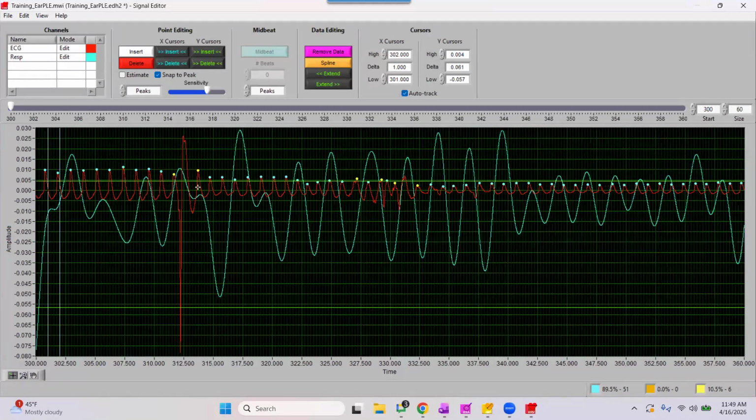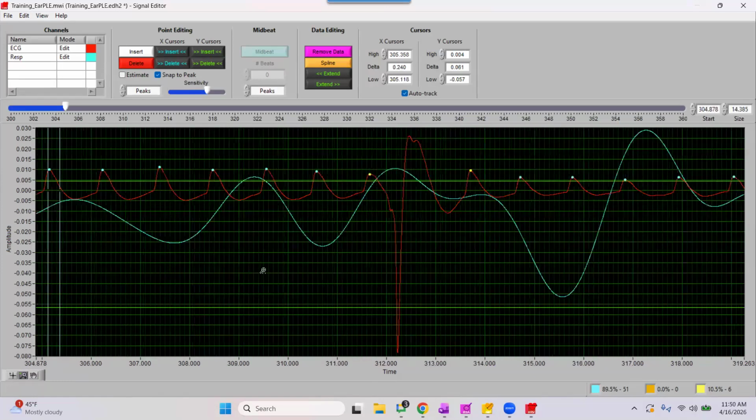However, we do have these two yellow beats in this large gap of time that we're going to investigate a bit further to insert our mid beats. So again, zooming into this section of interest, we have a peak here, the systolic peak, and we also have a peak on the other side. But in between these two points, with this big section of movement, it looks like a piece of data was missed, or that a pulse was missed in this section of movement.